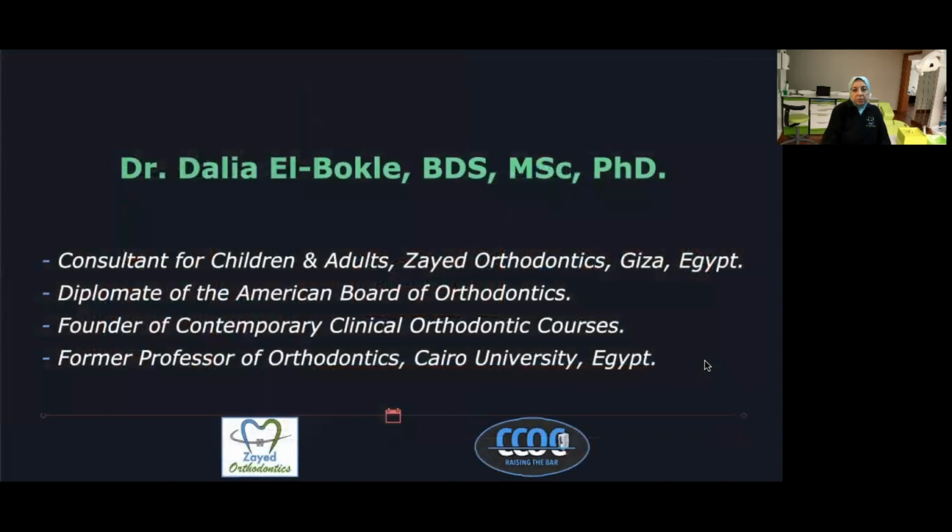If a picture is worth 1,000 words, this 3D simulation is worth 1,000,000 and is definitely an asset to my practice, not only for patient engagement, but also for practice promotion.